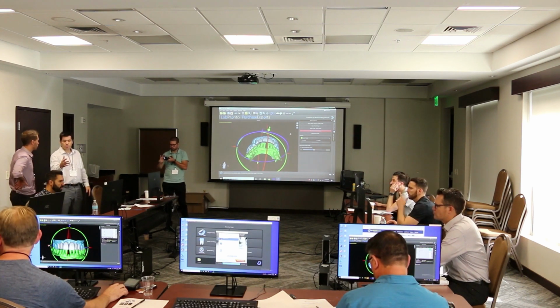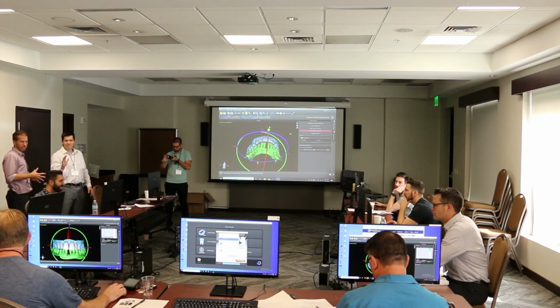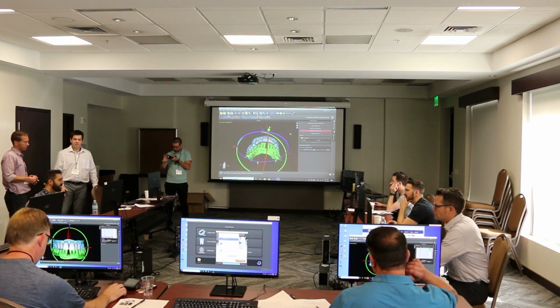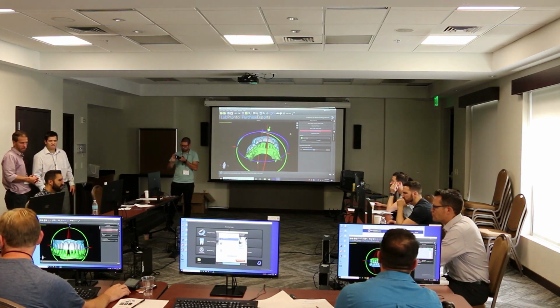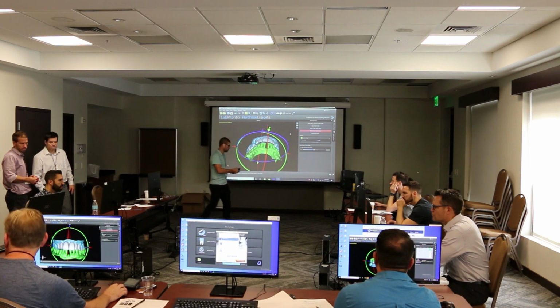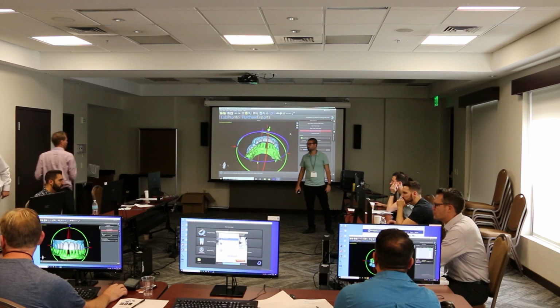So you're just trying to get things close. It's hard when you first use this software, like, how do I move all these things everywhere? It gets confusing until you kind of learn, okay, this ring does this. Every little arrow does this. Click and, yep. Yeah, there you go, big arrow, yep. Good there.